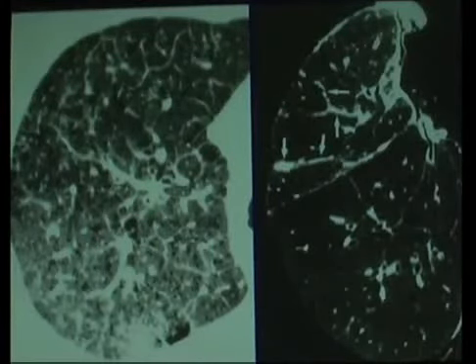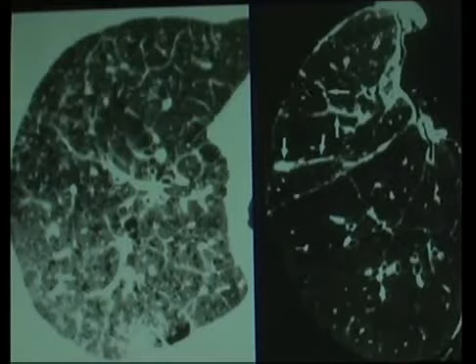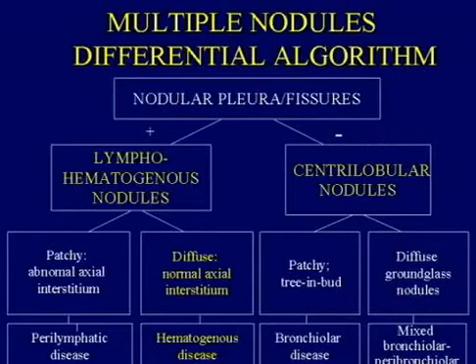And if, in fact, you look at this pathologically, that's what you see. Here's a secondary lobule. The septa where the lymphatics run are nodular, they're beaded, and you can actually see this running all the way along the septum here, the fissure, all the way to the central hilar regions. Classic for someone who's got lymphangitic carcinomatosis.